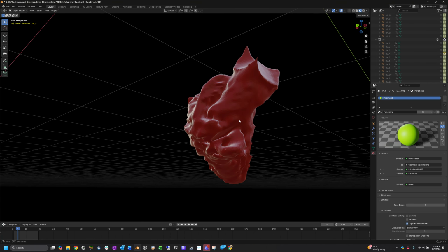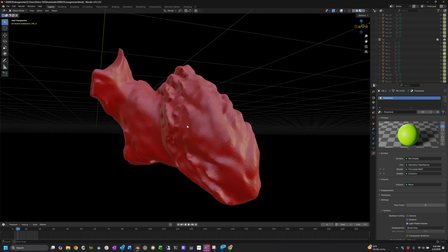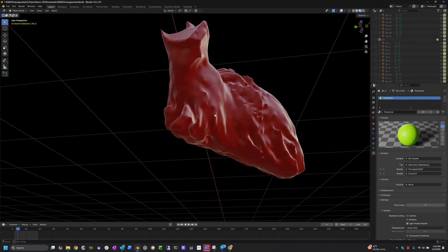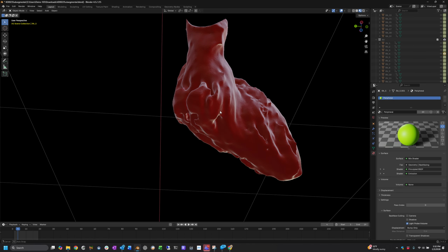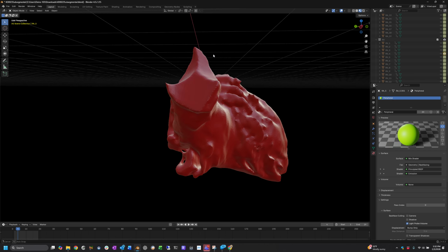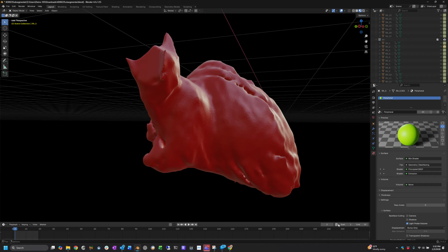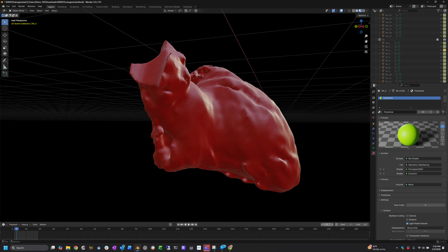This may be a little too shallow, and again, this one probably could have come down here. It's hard to say, maybe slightly too shallow, but it's close. It's not too bad. This 3 could have used some work.